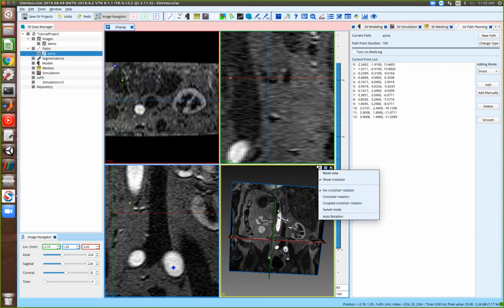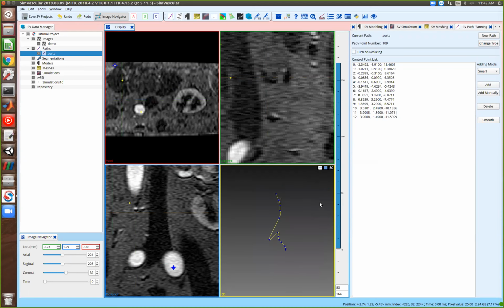And if I unclick the crosshair again, you can see what that does to this path line. It's quite odd looking. It's sometimes good to check your path line to make sure that there aren't any extra points that were accidentally put in there or somehow moved during the path line making process.